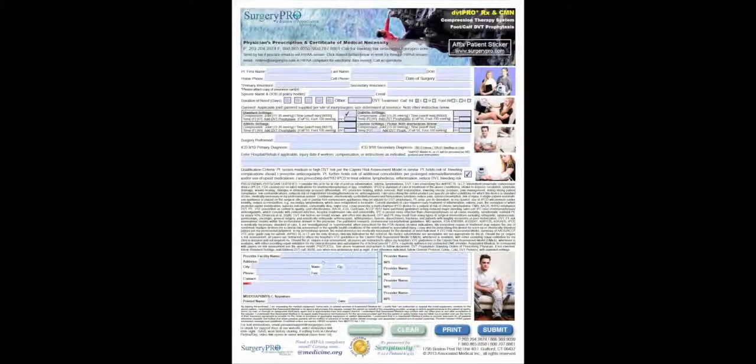So what you would do is fill in your practice information. Let's call you South Shore Orthopedic, and you would then fill in your address. You'd fill in your doctors. Again, I did all of that with just the tab key. I've got Jim Jones, MD, his NPI. I've got Mary Longwood and her NPI. And then what I'll do is save this.